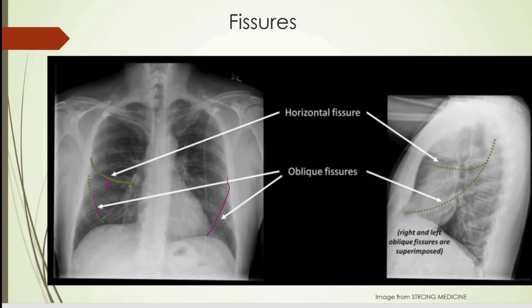If you are able to pick them out, then start thinking along the lines of excess fluid in the lungs. Or sometimes you can pick them out if they have a really good consolidation or infiltrate that's really defined in one lobe, like the right upper lobe, right middle lobe, which is this area here. This is the right lower lobe. Of course, this is the right upper lobe. And the left upper lobe. Your lingula is in here, but we'll talk about that a little bit later. And then your left lower lobe.